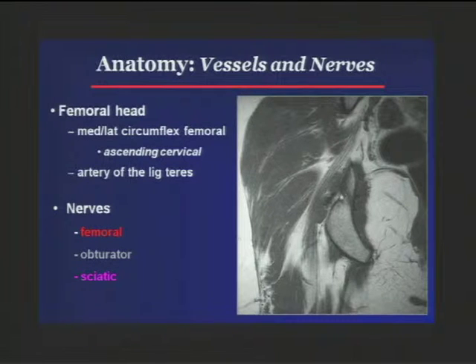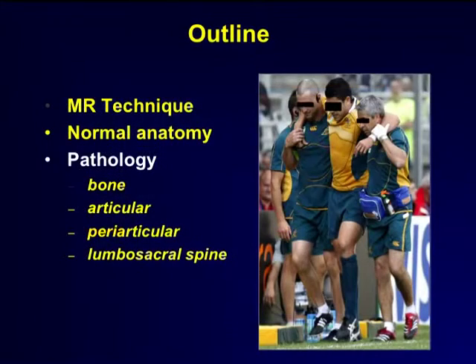I always love to just stop and take a nice deep breath looking at this, because it takes my breath away just to see the sciatic nerve in continuity coming down, again, right next to the common hamstring, right along the ischium.